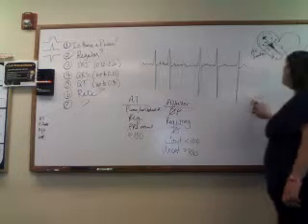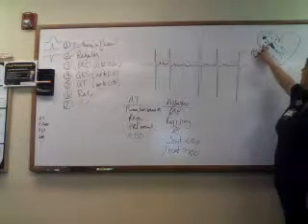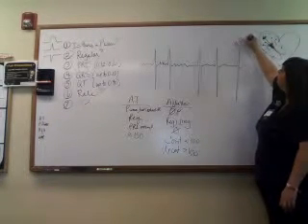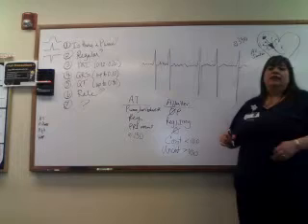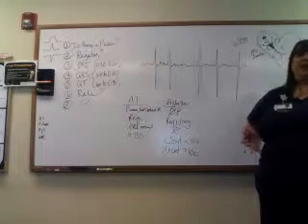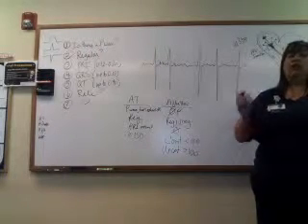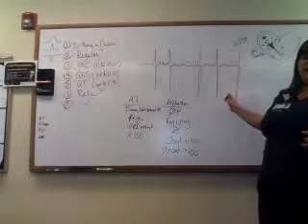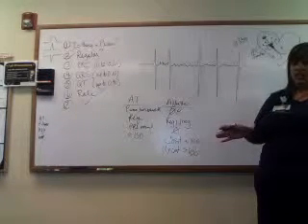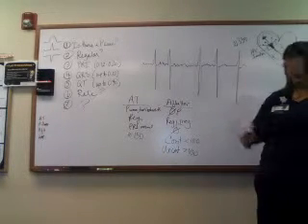Now, with this one, we have a rate in the atrium. These have sped up to approximately 350 beats per minute. Now, is the heart going to want to beat 350 beats per minute? I mean, think about that for a second. That's 6 beats for every second. That's huge. So the little guy by the safety net is saying, absolutely not. We're not going to let all of those stimulations through. So he's just going to pick when to fire a few, okay?